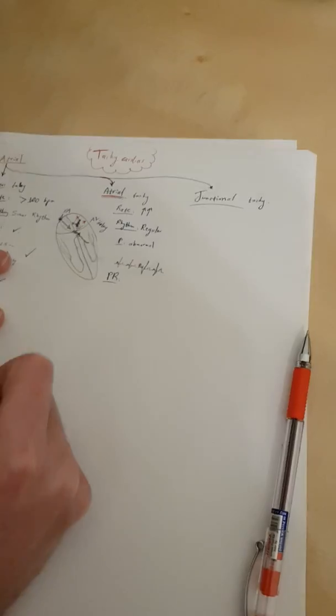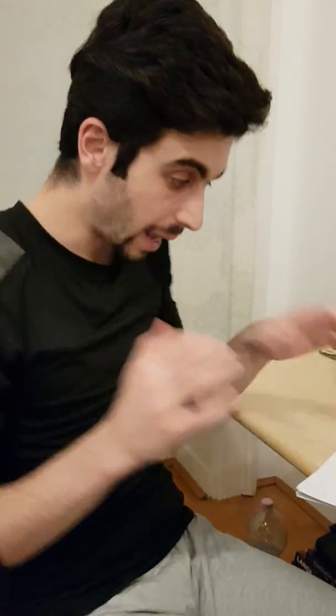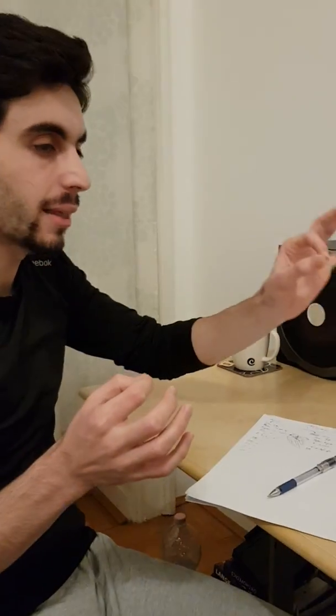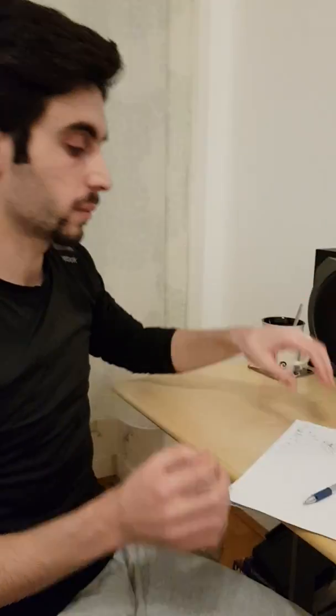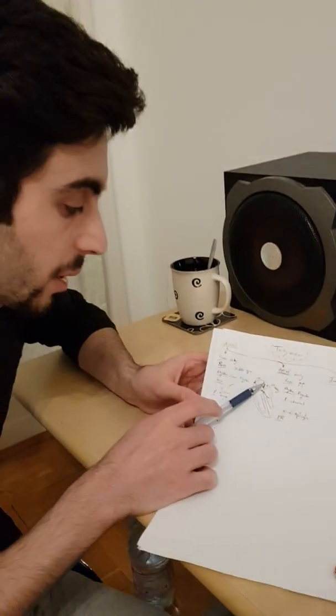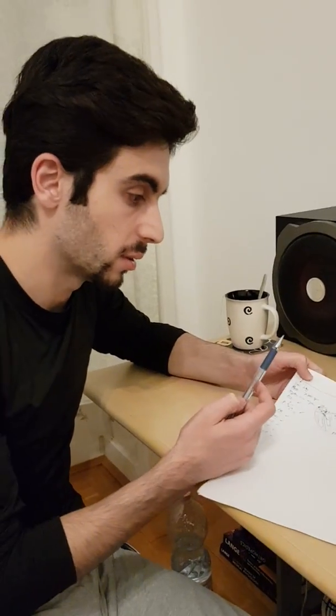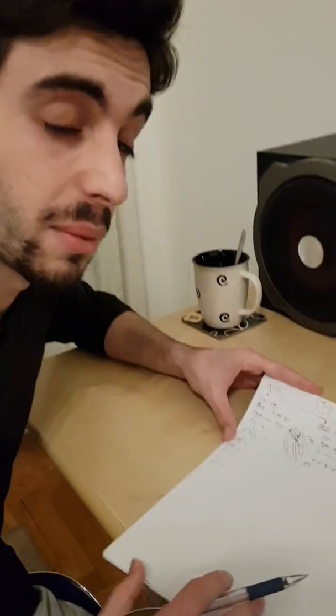Then PR, right? Now here's the thing. PR refers to what? It refers to the P and the PR segment. So the PR segment and the P wave before it. Meaning it refers in reality to the depolarization of the atria and then the silence or the delay that occurs at the AV node. So here's the thing, if we have different foci giving beats from different places, then the depolarization of the atria is going to be different, right? So that's why PR is going to be different. So it might be shortened, might be prolonged, might be normal, okay?